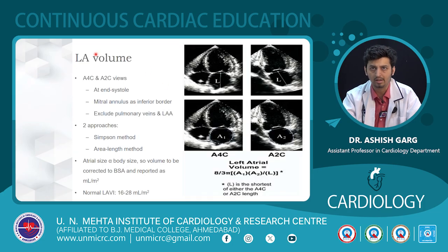Coming to the LA volume index, basically what we need to know is that if there is diastolic dysfunction, the LA volume will increase, and it is a good marker of chronicity of the condition. So there are two approaches to do this, the Simpson method and the area length method, and you measure the LA volume keeping the mitral annulus as the inferior border. You exclude the pulmonary veins and the LA appendage to measure the LA volume.